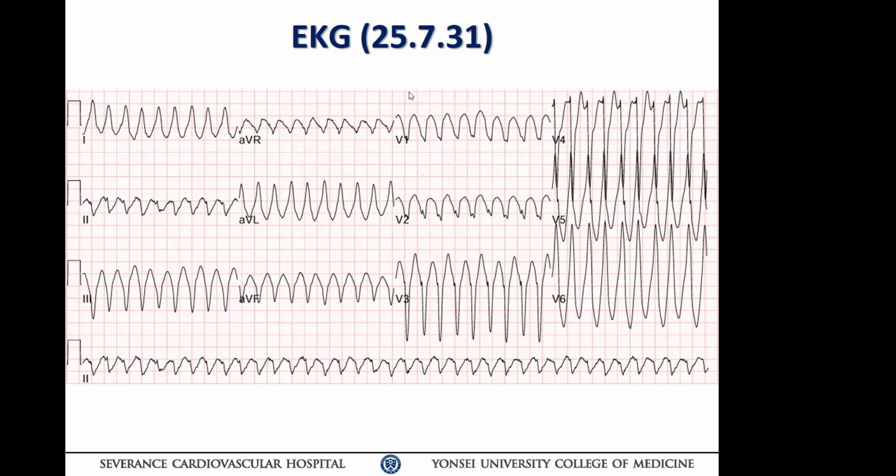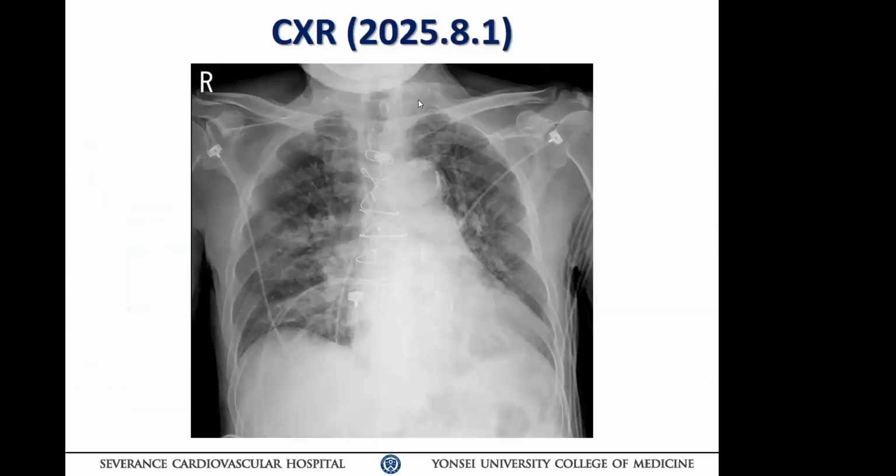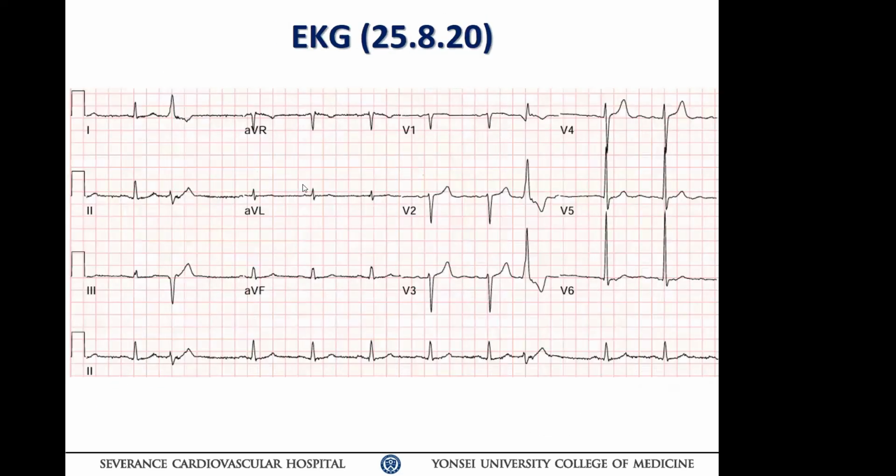And another point: you saw the rare PVC ECG during sinus rhythm. The QRS morphology is quite different in the precordial leads, so it could come from the septal area, right? But the axis of leads 2 and 3 was similar.